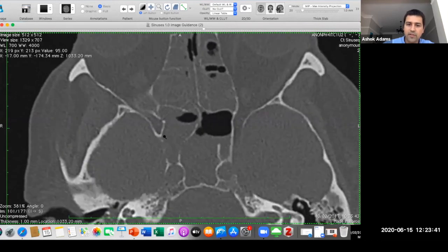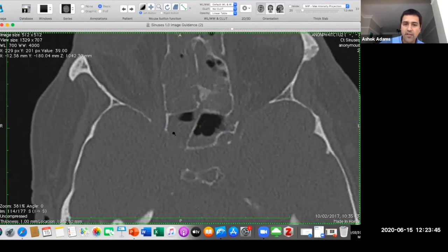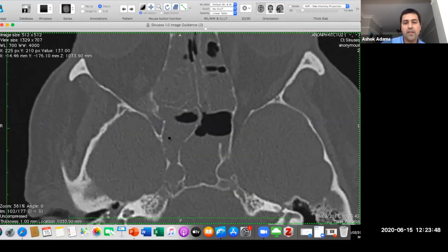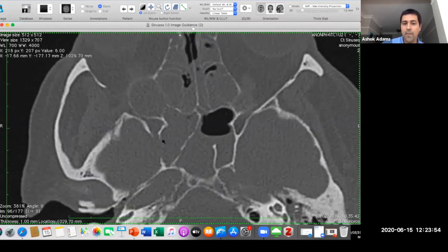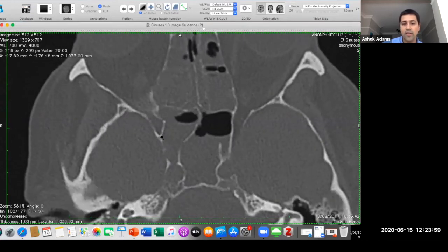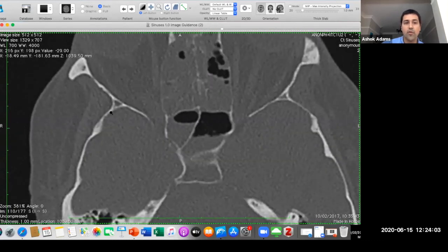So again, when you see this, you're going to flag that. As radiologists, we drum it home into our trainees: you always have to get on the phone and speak to your ENT surgeon, particularly if this patient's immunocompromised. These patients can deteriorate rapidly. The other thing we typically advise is further MRI imaging, because you want to know, given that it's gone into the sphenoid with some bony erosive change, whether it's gone into the cavernous sinus, and whether you've got intracranial spread of the fungal infection. So that was an invasive fungal sinusitis, and the key was looking really at the fat planes.